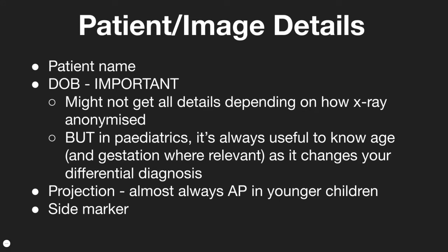You shouldn't be calling respiratory distress syndrome in a term neonate, as this is very unlikely outside of the context of gestational diabetes, and conversely, you shouldn't call meconium aspiration in a preterm neonate, as meconium passage is very uncommon in preterm deliveries. You must also consider the projection, which is typically AP or anterior-posterior in neonates and younger children.